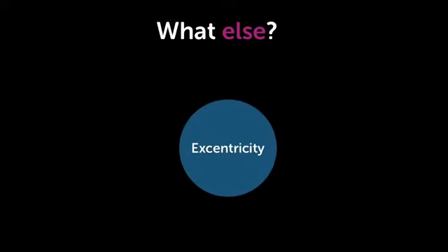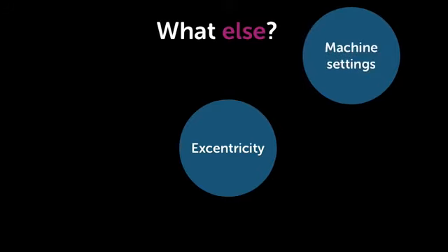Eccentricity. If a jet is very eccentric, and if it impinges on a wall, it appears smaller than it in reality is. We will underestimate the severity of mitral regurgitation. Machine settings. If we choose a gain setting which is too high, the jet will appear larger, and we will overestimate the severity of mitral regurgitation.